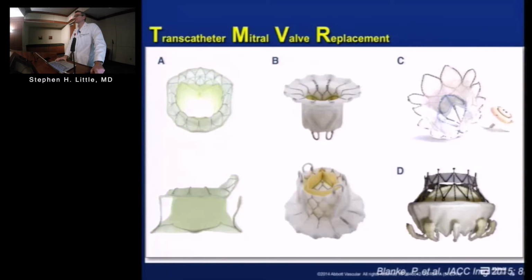So, transcatheter mitral valve replacement. This is TAVR, an inch to the right, or an inch to the left.